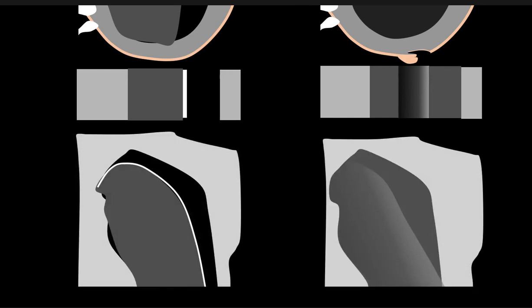Now, cartoon in, like we were looking at a radiograph, zoomed up, the guy with the pneumothorax here. I'm going to point out that's the critical line, right? So you see that pleural line, and that's the most important feature. As opposed to our friend over here with the skin fold, it's not a thin line.